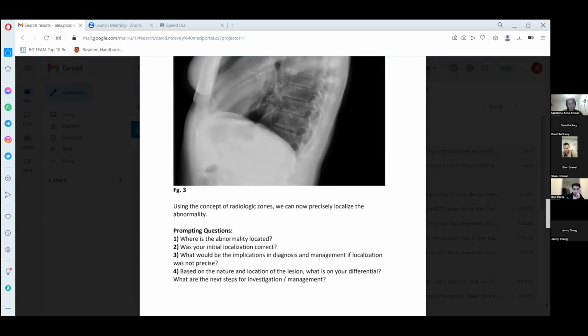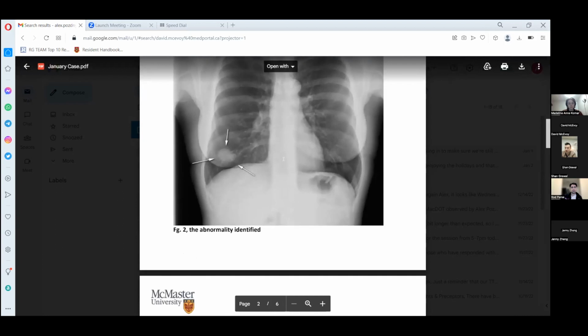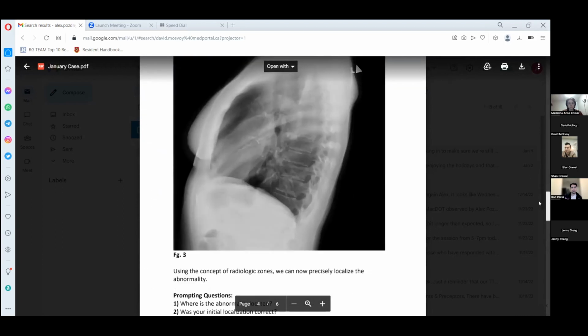And also, in terms of management, obviously in the lungs, a chest X-ray won't be conclusive for a lot of things. It will help you with things like pulmonary edema or pneumonia, but even pneumonias can oftentimes be tricky, because you can have a hyperdense opacified lesion, but you don't know whether it's a pneumonia or a tumor, especially here, which is very well localized.